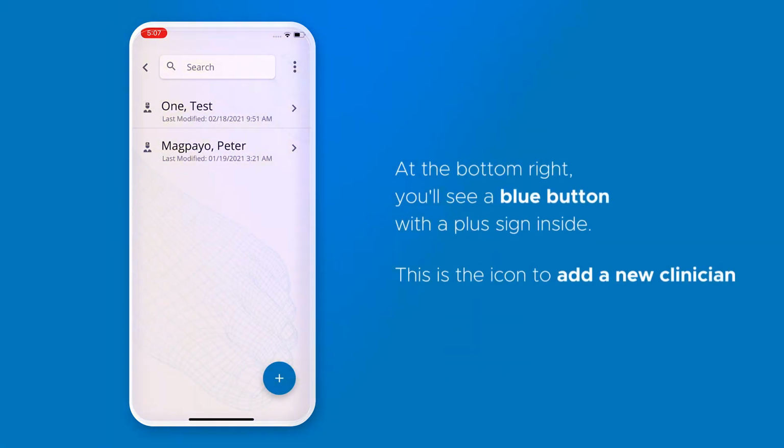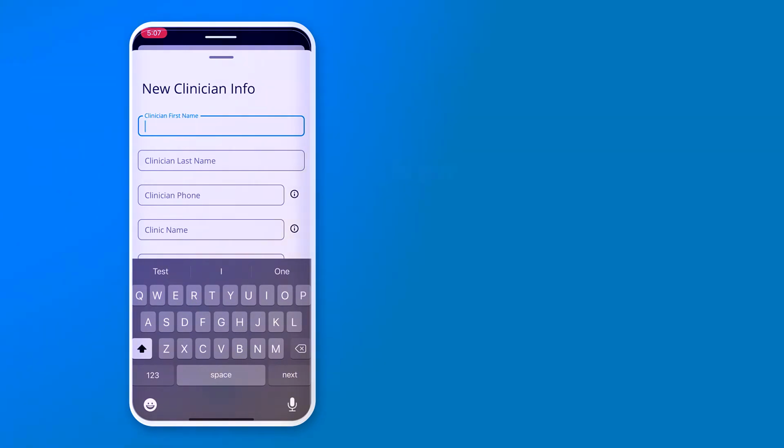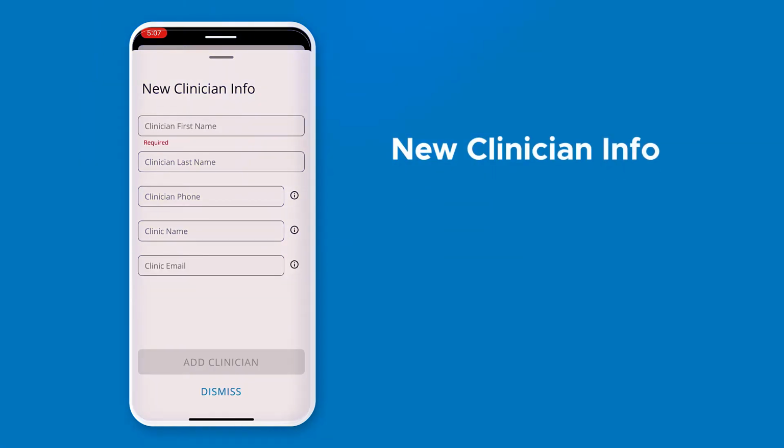At the bottom right of the Clinicians list screen, you'll see a blue button with a plus sign inside. This is the icon to add a new clinician. After tapping the blue button, you'll see the new Clinician Info screen. You can then enter the new clinician's information.